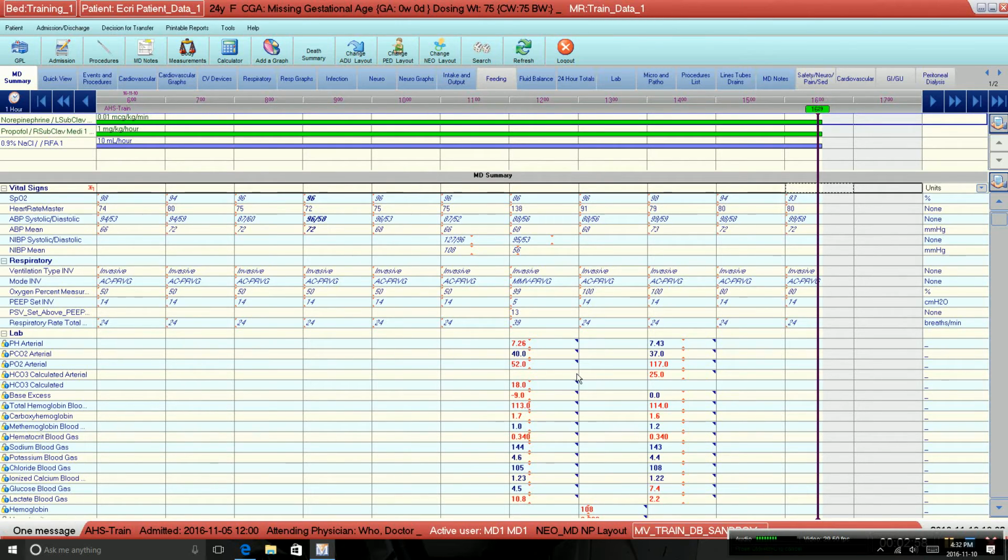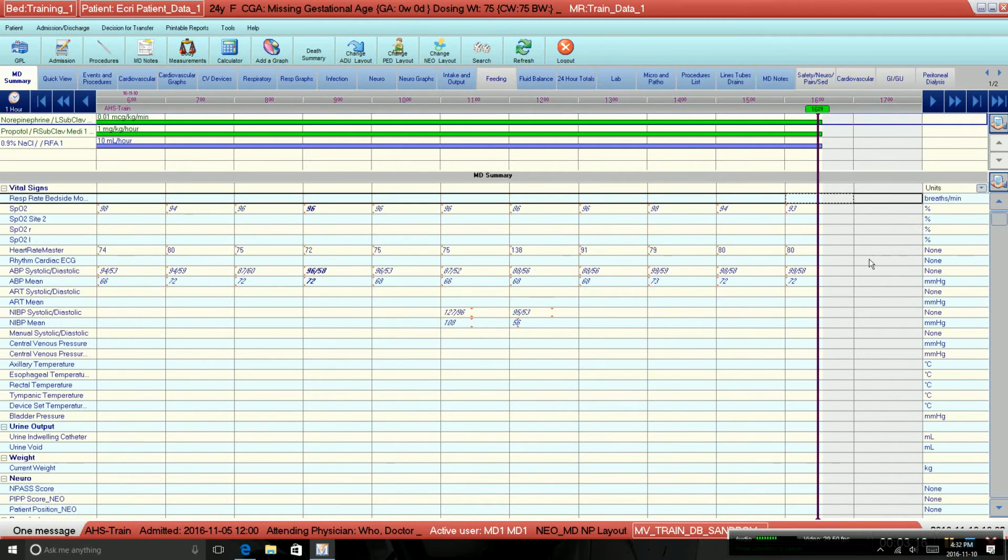If you want to see all of the parameters that are available for a specific section, you can use this icon over to the side here, click on it, and it will give you the ability to show empty rows. What this means is, as you can see here, all of these temperature values weren't present in the previous view before I clicked that button.